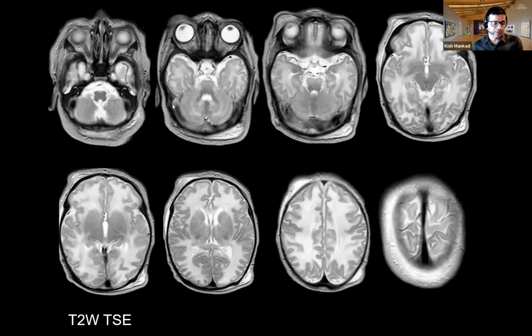This is a case which a particular neuroradiologist called venous sinus thrombosis based on basic principles. The other one did not, and there was a contest between the two of them. Which test would you use to resolve the problem? And whilst you are going to answer that on chat, I can tell you that this child does have some abnormality within their deep gray structures.